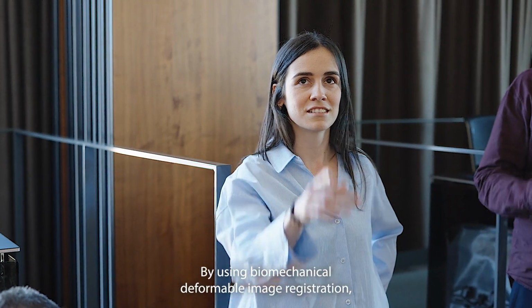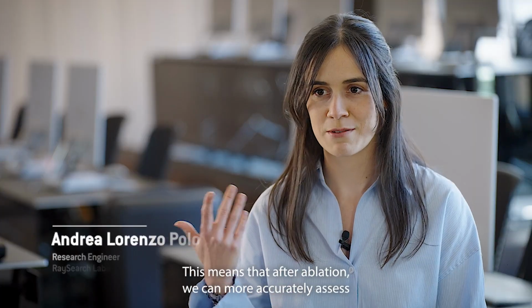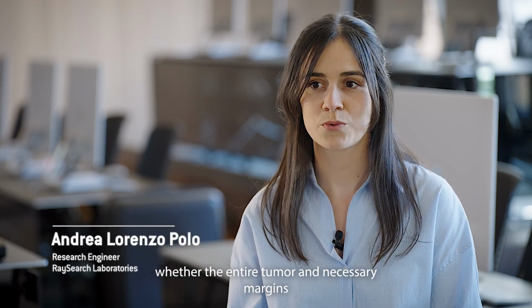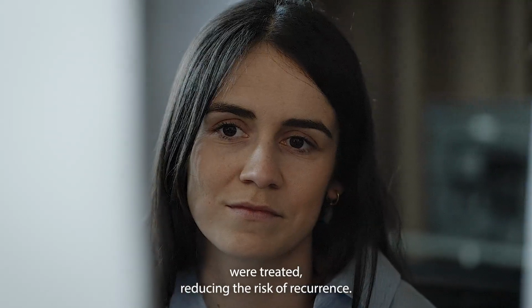By using biomechanical deformable registration, we improve treatment verification. This means that after the ablation, we can more accurately assess whether the entire tumor and necessary margins were treated, reducing the risk of recurrence.